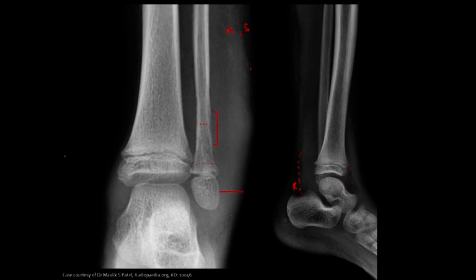So we see extension of that tumoral process from the bone into the soft tissues. Here, this is more the appearance of swelling and not something growing out of the bone. Not always an easy call to make, though, so obviously I would still keep those three differentials: osteomyelitis, osteosarcoma, and Ewing sarcoma.